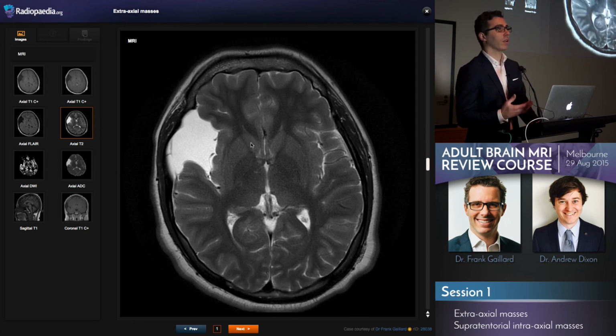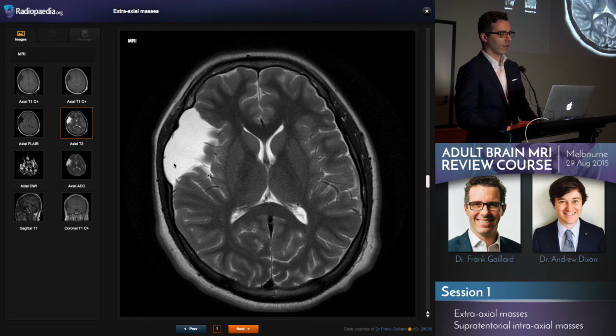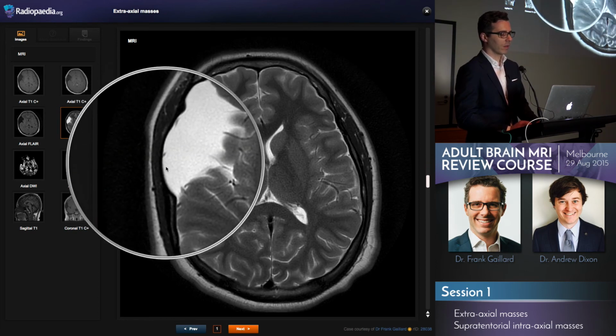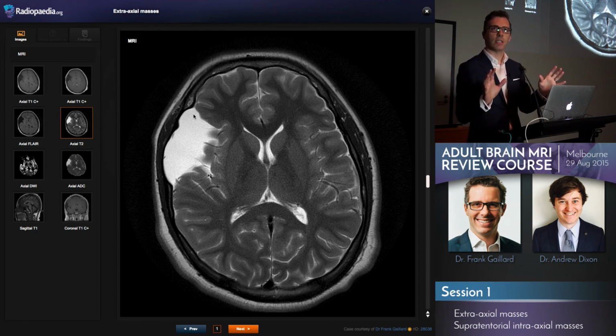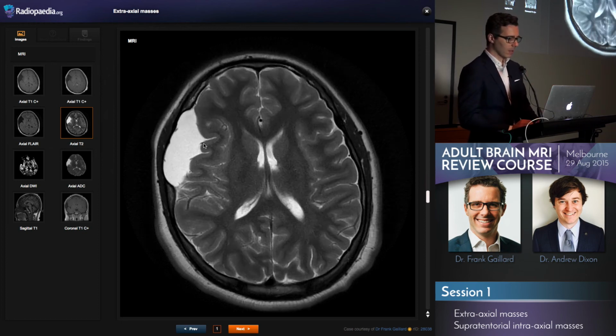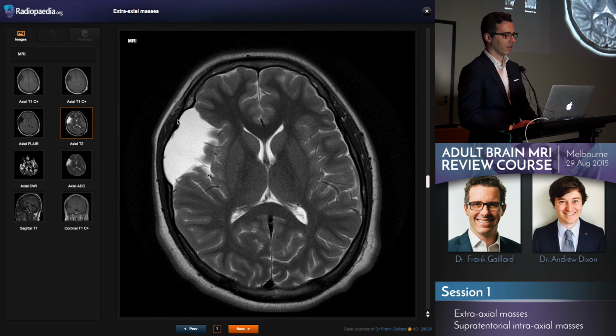And this is a typical location for an arachnoid cyst: middle cranial fossa, extending into the sylvian fissure and widening it. Note how it remodels and scallops the bone. This is merely due to the fact that this is an almost spherical pocket of incompressible fluid. Every time you have a cardiac systole, the brain expands and pushes the cyst up against the bone, and over years that's enough to remodel it. CT will show that the bone is very thinned, almost dehiscent in places.